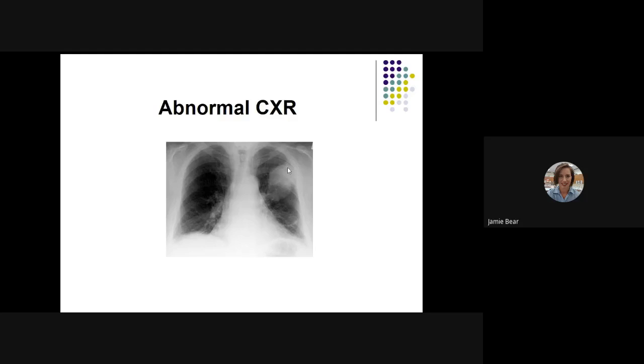This could be a pulmonary contusion here, atelectasis, and then we're not seeing good expansion with the lungs, okay? So this is pretty bad hypoinflation. So this patient, once again, would be hypoxemic, showing signs of respiratory distress. And this patient will probably need a lot of therapy. So this patient will probably need to be intubated and get all of this.